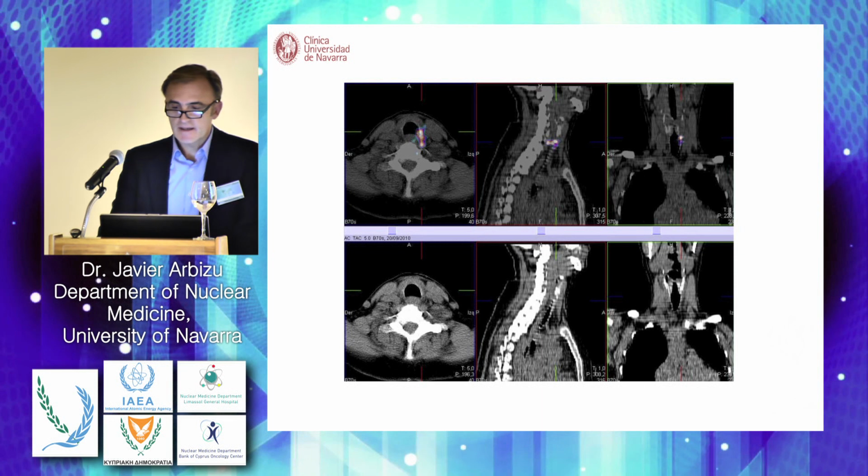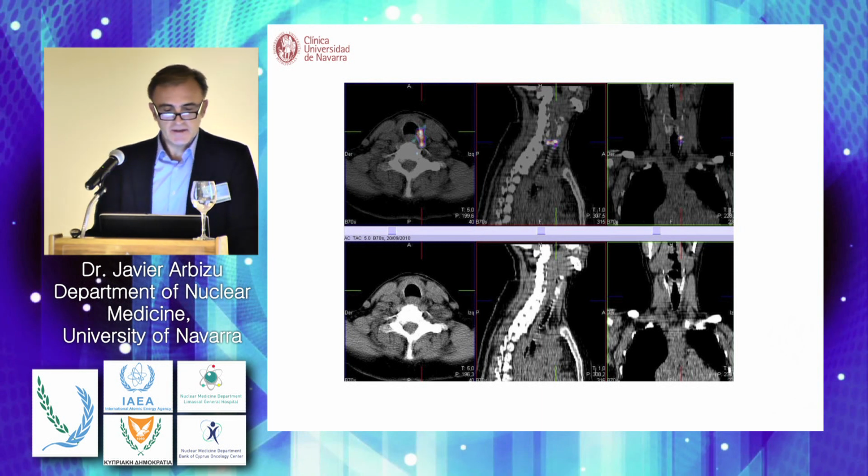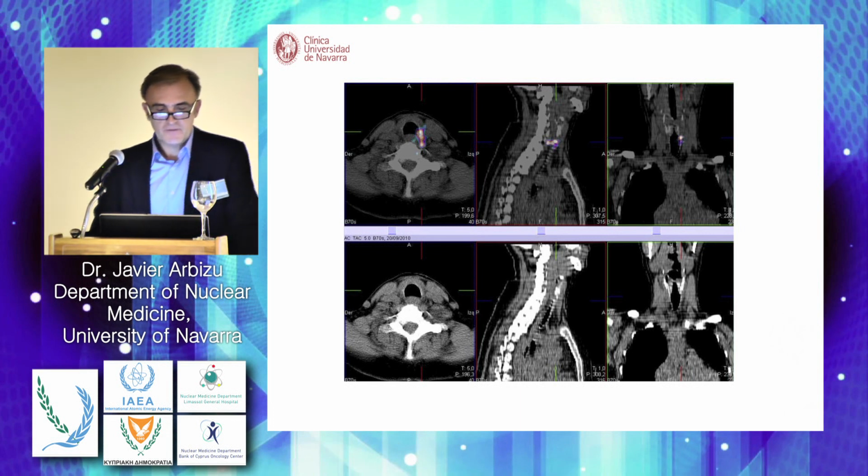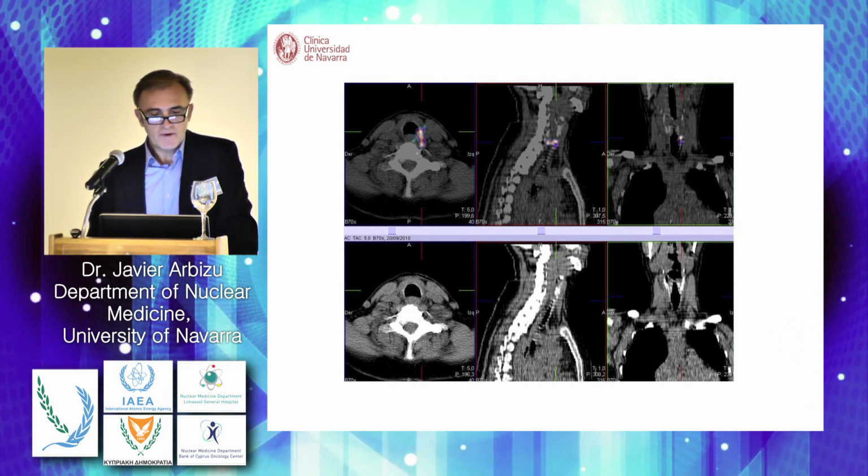Let me show you an example of this. This is a patient with a clear focus on the left. And what do you think? Is this a lymph node or just a remnant? Well, when we performed the study, we saw 2 foci.